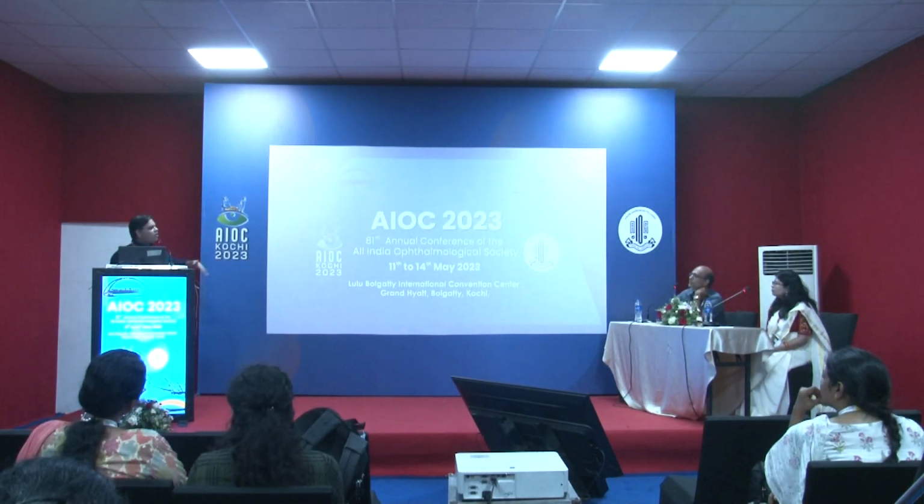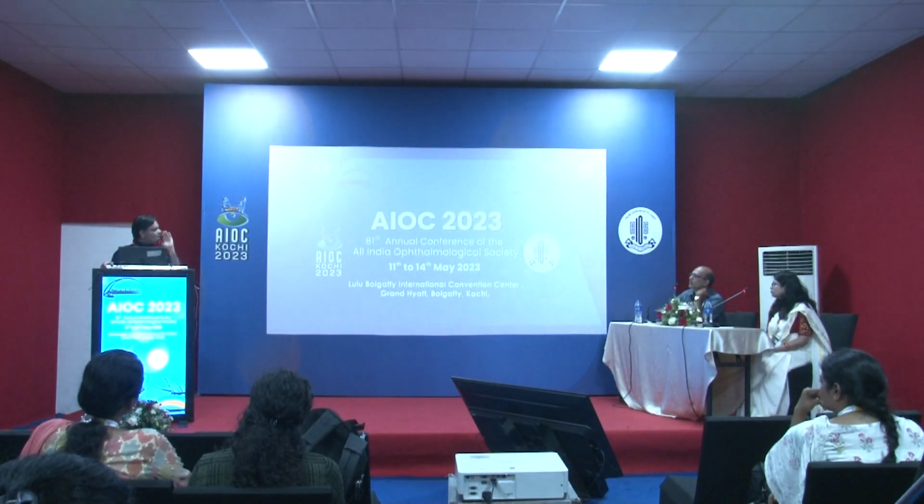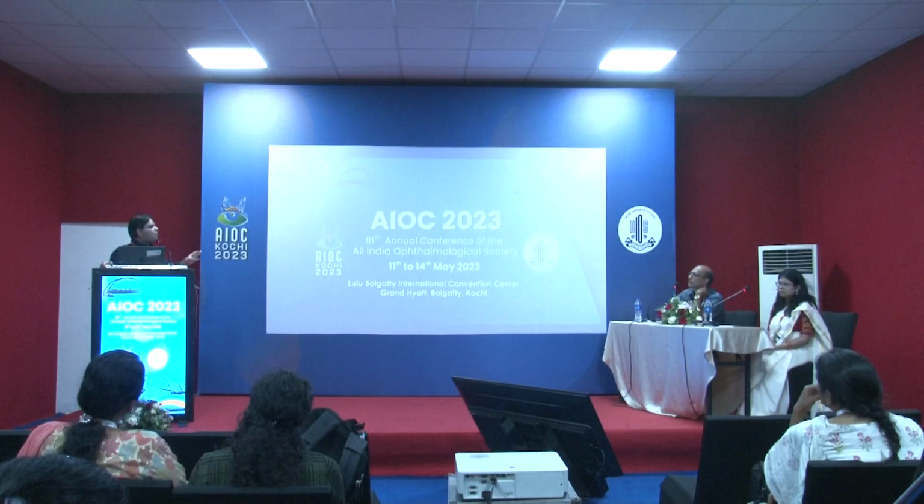In all of our imaging, we found that diffusion restriction and non-enhancement in soft tissues anywhere, whether in the turbinate, in the tissue near the medial canthus, or even in a sinus, is more likely to be mucor. Ophthalmic artery invasion is one of the earliest signs. I've seen it happen with as little as one air cell involved in the ethmoid.